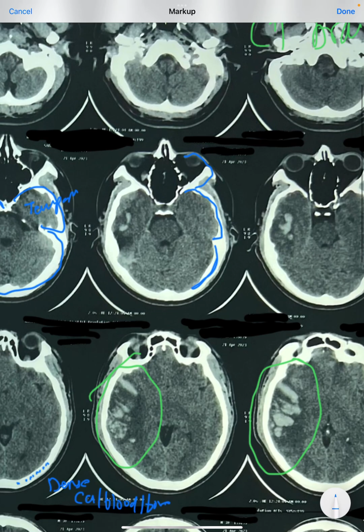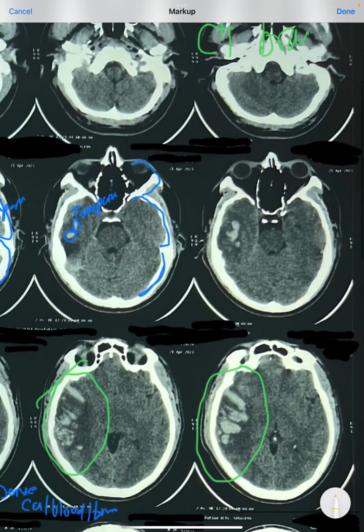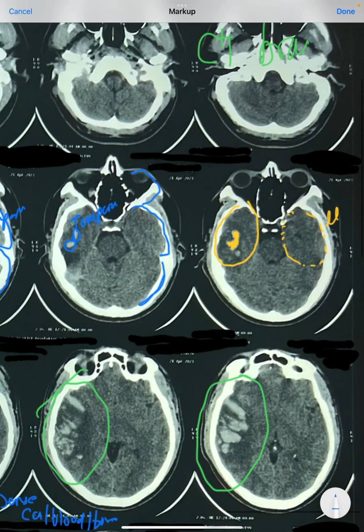So it's very easy to see that this is the temporal lobe of the brain, where we can see this bleeding is here. So the temporal lobe of the brain is affected. This we can very clearly see. This is the left temporal lobe of the brain, and here it is right, and we can very clearly see a very hyperdense, or very much dense white structure, which is the bleed. And you can see around this bleed is a dense black structure. This is all marked edema.